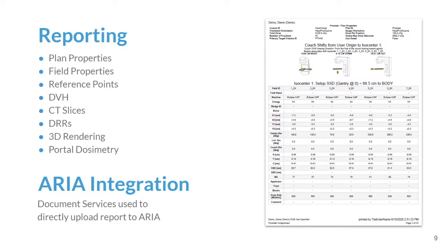The other neat thing we've done with reporting is a direct integration pushing to ARIA document services. So we're pushing all these directly to that service, so you just set it up. Once you click a button to print the report, it'll go right into the patient's record and verify chart, and it'll be there and ready for use on the chart check.